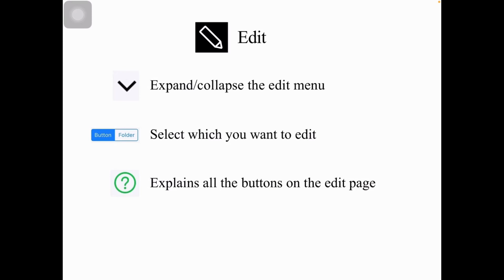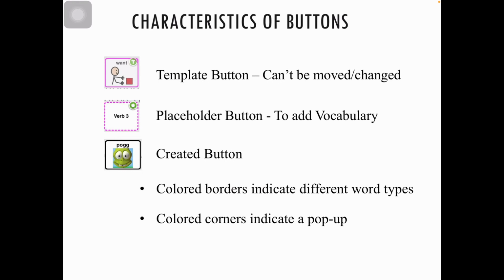And then finally, another green question mark, and that's great. As soon as you hit it, all of these buttons get labels put on them. Although I find them kind of small and I'm half blind, but there's labels on all of them so you can see what they are. Hopefully you can see better than me.